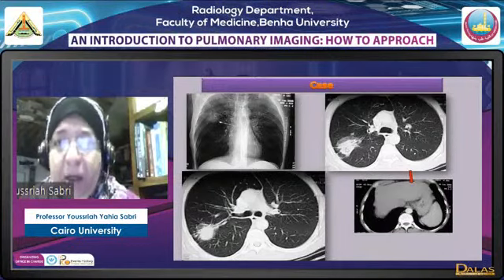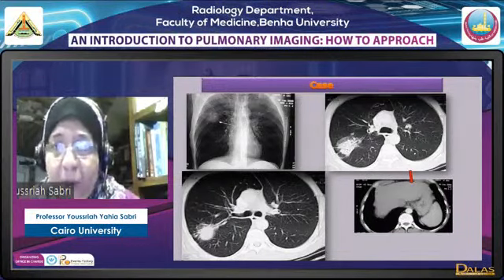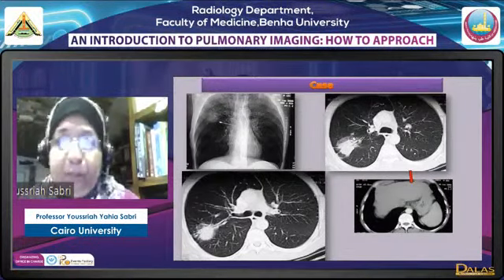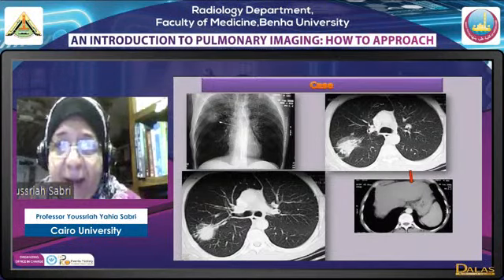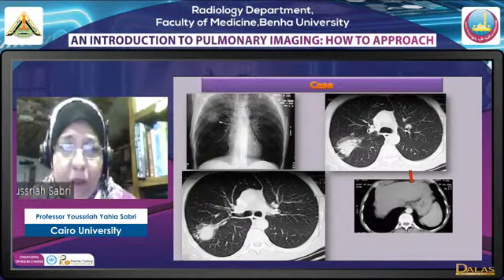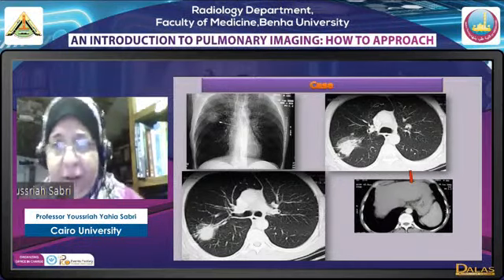يعني ايه هيلو ساين؟ ادي dense lesion surrounded by a ground glass opacity، يعني a less dense opacity, a gray lesion. اوكي. الحاجه الثالثه ان انا عندي التاجز، البلورال tags which join the lesion to the pleura and it suggests pleural infiltration.